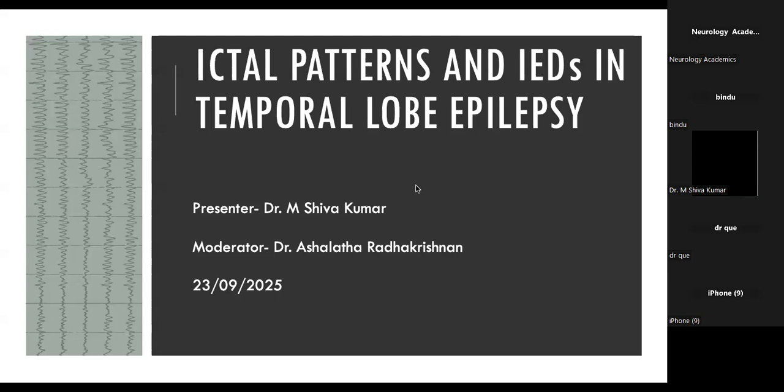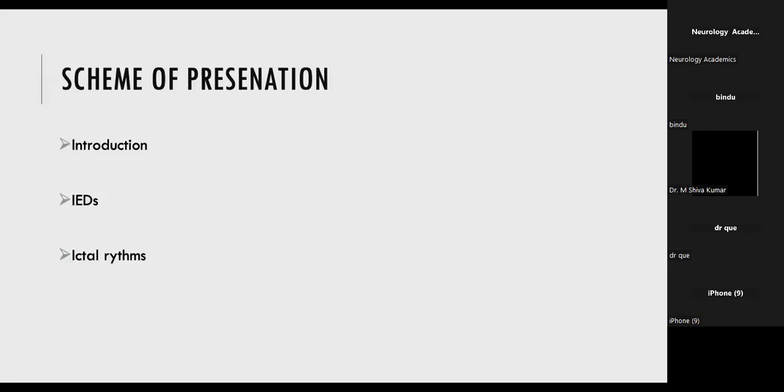Good morning, everyone. Today's EEG presentation is on ictal patterns and IEDs in temporal lobe epilepsy. Presenter myself, M. Shivakumar, and moderator Ashalatha Madam. The scheme of presentation will go with introduction, IEDs, and ictal rhythms.